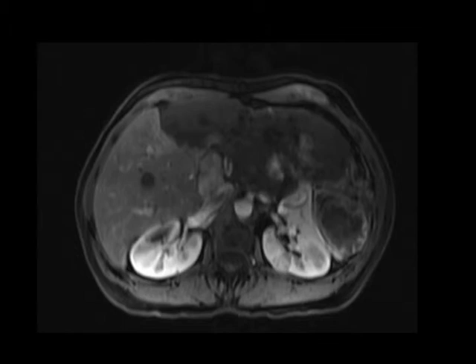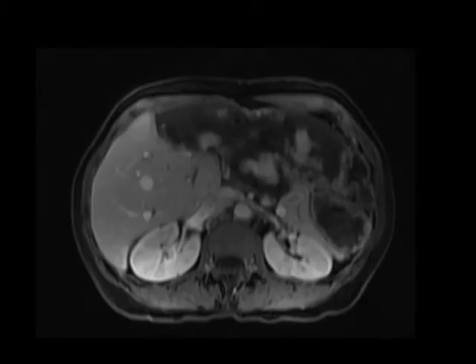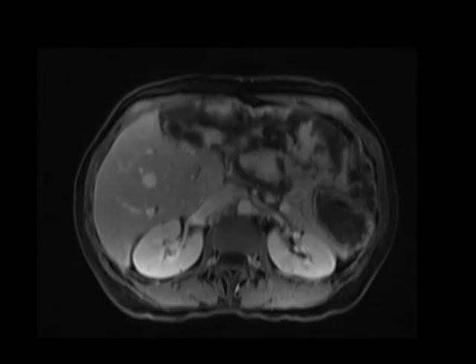an example of an entity that I think comes up pretty commonly in day-to-day practice, but this particular example of the entity is so large that in some instances it can be a little bit confusing for the reader. Now notice on the T2 weighted images that this lesion is incredibly hyperintense, very bright, and if you look at the T1 post-gadolinium images at various stages of contrast enhancement, early, portal, delayed, you can see that this mass shows peripheral, nodular, globular enhancement with gradual centripetal fill-in.